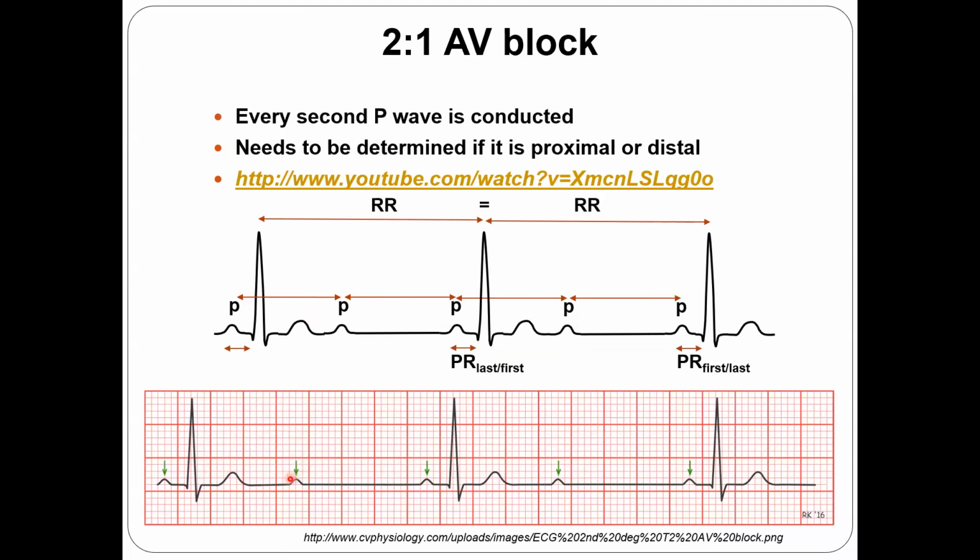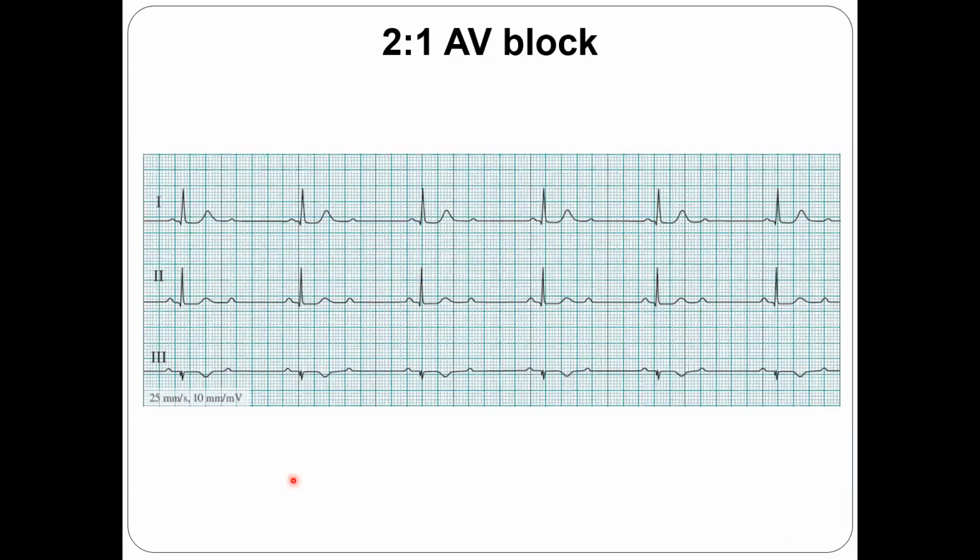I should mention that the T is bigger than a P wave. And if you do have QRS, you have to have a T wave. Don't forget it, because sometimes when we were talking about impulse formation abnormalities, you might assume that, oh, that T should be the P wave. No, the T has to be there if you have QRS, and an additional wave should be the P wave that is smaller and distinct from the T wave. Okay, that's bradycardic, as you see, and you always have a P wave with the same shape.